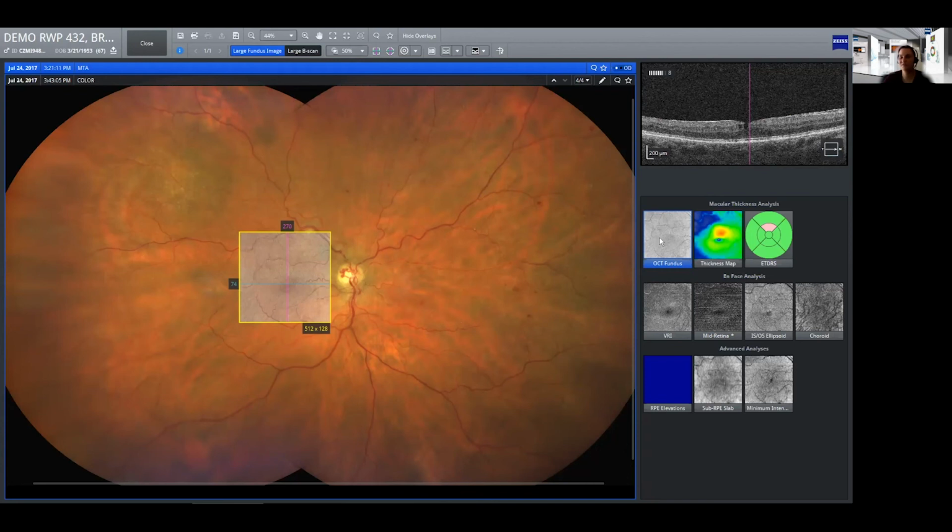You're looking at it from two different sides, and that makes it a lot easier for your patient also to understand, because you are not sending them back and forth between multiple screens and trying to have them remember what they have been seeing, or having to make up the logic in their own head on how all these things correlate to each other. And of course, some patients are more curious than others.